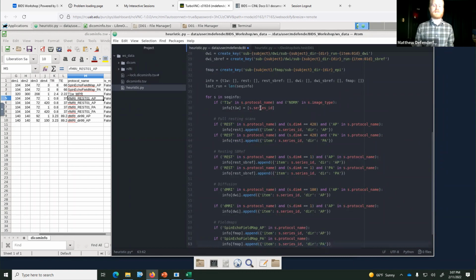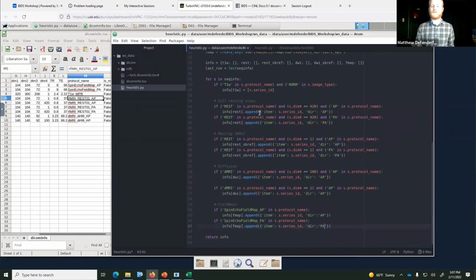So you can use the same heuristic file later on if you want to, compared to what you have here, which doesn't necessarily work. What I will say is that when using this tool, any errors that pop up in naming are almost always attributable to the heuristic file. So that should be the first place you look whenever any errors crop up when the conversion actually happens.